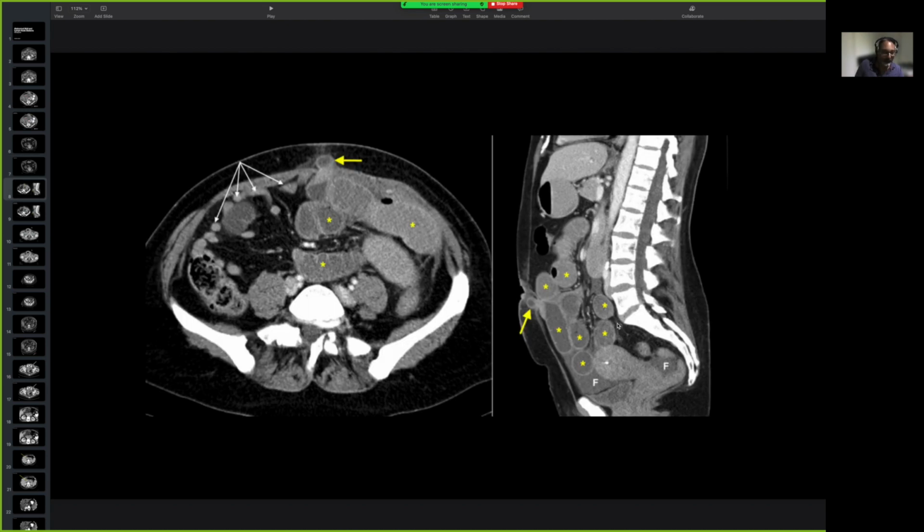Now, what was this? This is another hernia, and it's causing a bowel obstruction. So I think this was an incisional hernia. This was post-operative, and after healing, the anterior abdominal wall in that area becomes weak, and a hernia protrudes out of the incision. So this looks like an incisional hernia. And if you notice, it's actually not coming out of the patient's skin. You wouldn't be able to see this on external examination, but it is a hernia coming out through the abdominal wall. And it's caused a bowel obstruction, so it's pretty serious. So, incisional hernia with bowel obstruction.